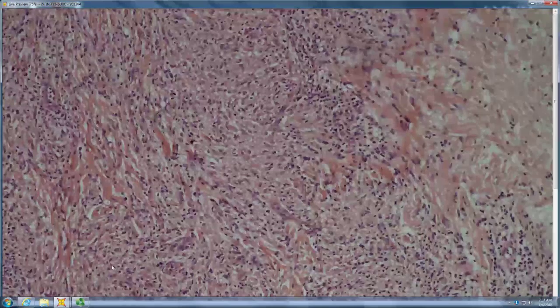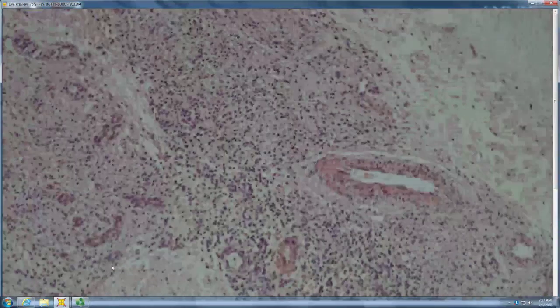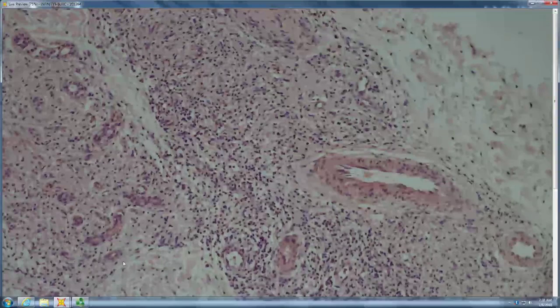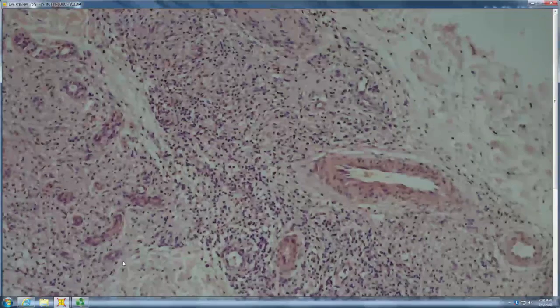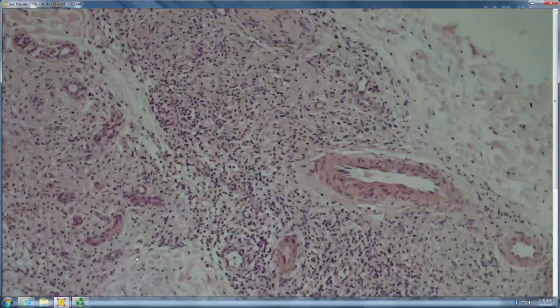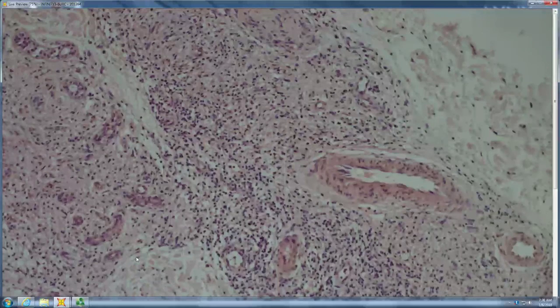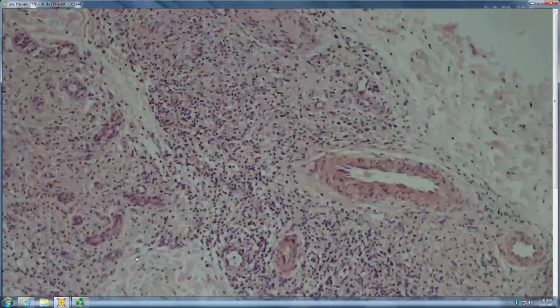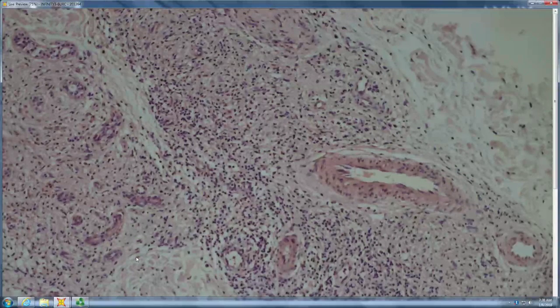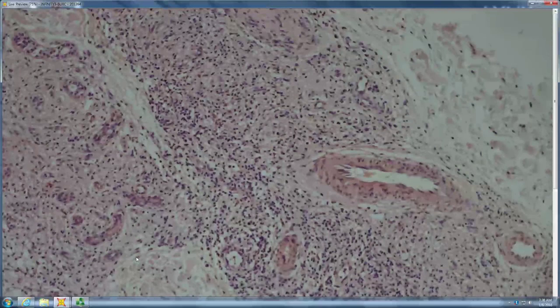And then you've got the lymphs. When you have this many lymphs, it's most likely a reactional state, right? Leprosy often gets biopsied when it's in reaction. So a reversal reaction, downgrading reaction, ENL. Erythema nodosum leprosum is leukocytoclastic vasculitis that occurs by immune complexes that form locally where the organisms are. So it's not circulating immune complex, it's local immune complex deposition in sites of disease.